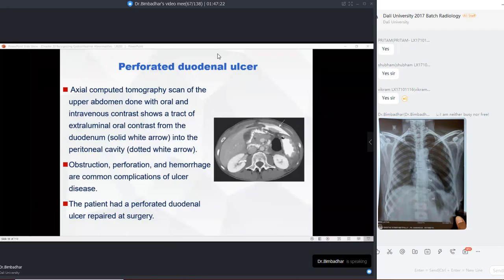It's a very interesting case. I guess most of you will not be able to diagnose this condition because I tell you beforehand that it's a quite normal X-ray. There is no abnormality in it. Okay, but you have to tell me what could be the clinical condition behind this. Did you understand the case?